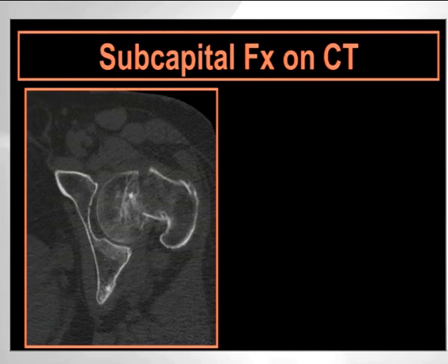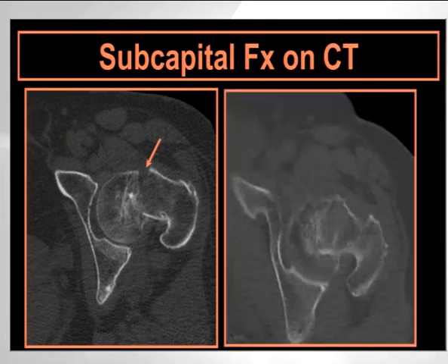So here is a fracture on CT. Easy to see, we have distraction, displacement, and these are the fractures you would see on radiographs anyway. Then we have a fracture like this, very hard to see. And this is an impacted fracture. And I find impacted fractures easier to diagnose on radiographs than on CT, maybe just because I'm used to seeing them on radiographs. But especially if you're not very experienced and you're not looking for fracture on CT, you can completely miss it. Because again, our eyes are not trained to look for sclerosis as fracture. We are just so trained to look for lucency.